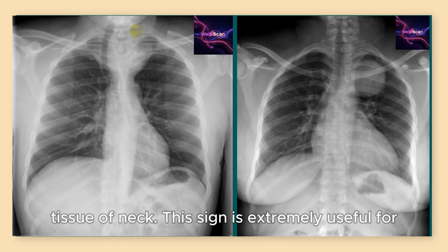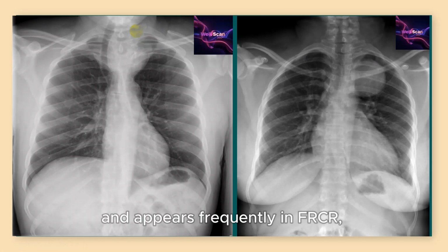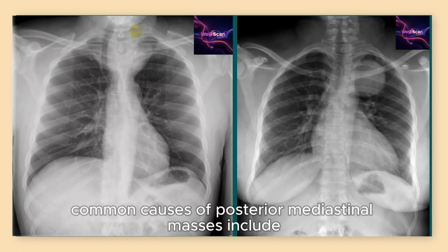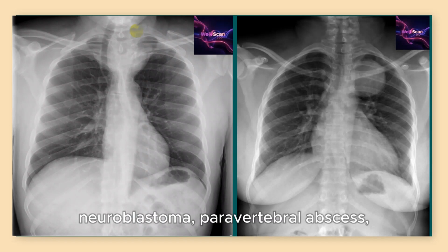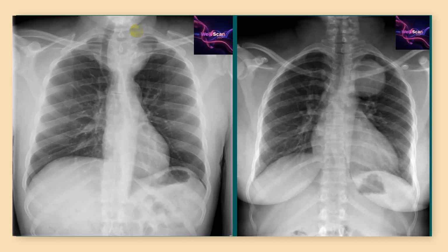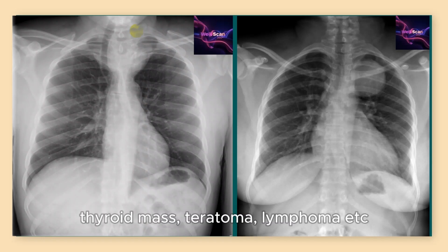This sign is extremely useful for differential diagnosis of mediastinal masses and appears frequently in FRCR, FCPS Radiology, MD Radiology, and Radiology Viva exams. Common causes of posterior mediastinal masses include neurogenic tumor, schwannoma, neuroblastoma, paravertebral abscess, extramedullary hematopoiesis. Common anterior mediastinal masses include thymoma, thyroid mass, teratoma, lymphoma.